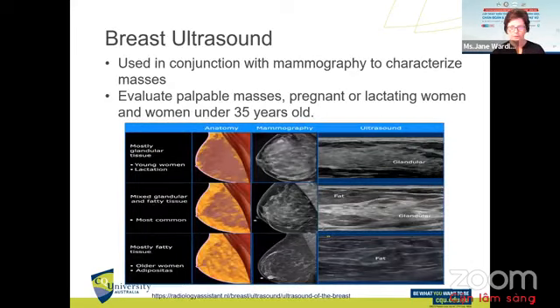So breast ultrasound is done in conjunction with mammography in many cases. In Australia, women are screened for breast cancer from the age of about 50 with mammography. Ultrasound is also utilised in the screening program to further assess any masses that might be demonstrated on a mammogram. Symptomatic women with palpable breast lumps of any age are also offered mammogram and/or ultrasound to assess the nature of the mass.